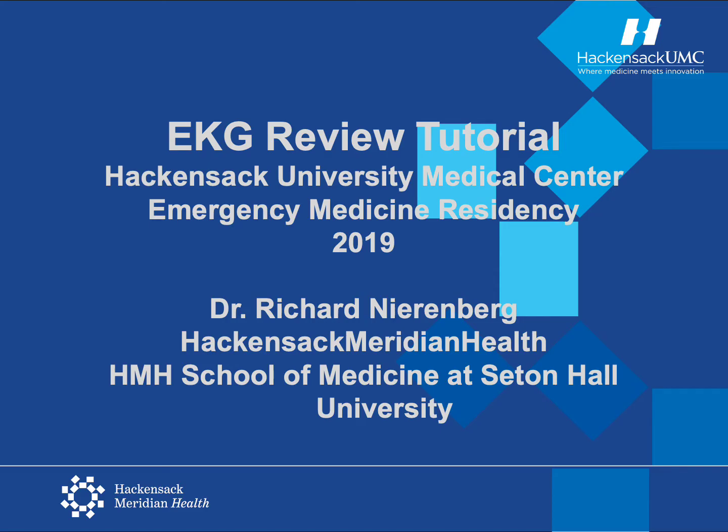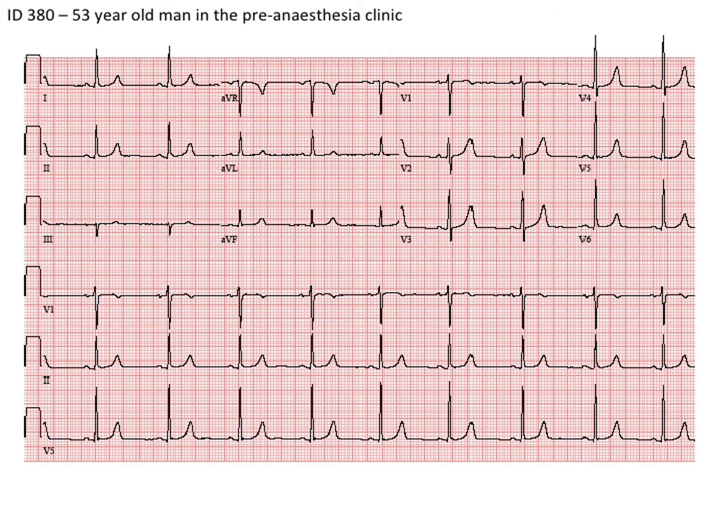Let's get started. What does this tracing show? This is a normal EKG. The vast majority of tracings you will be asked to read will be normal, or essentially normal. What do you look at to determine that this is true?